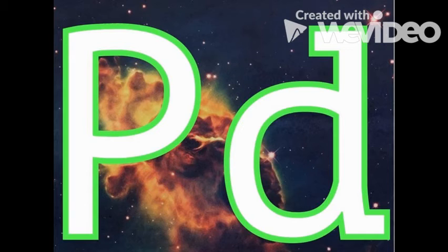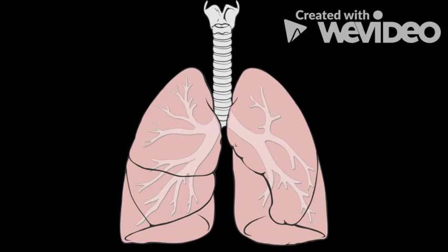Palladium is an application that helps doctors to detect what disease a person is suffering from. It uses image recognition to achieve this. Millions of people die every year because of various forms of lung disease, and many times it is because doctors misdiagnose a patient. Palladium aims to solve this issue by using machine learning to help doctors diagnose a patient.